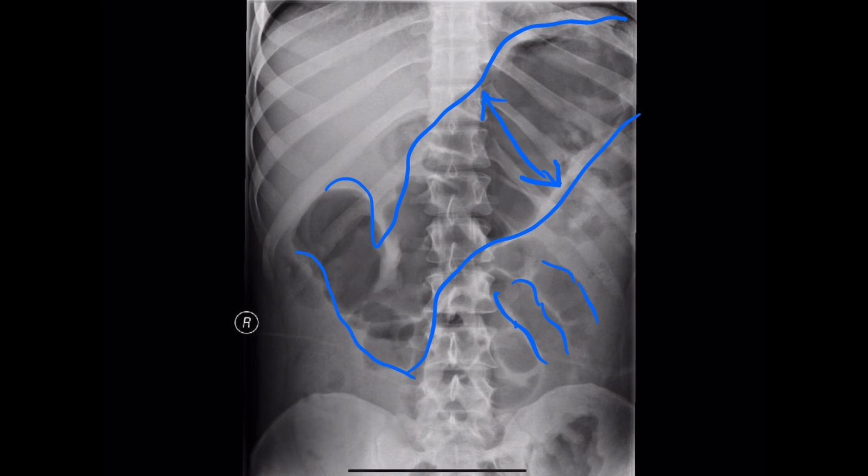Okay. So this is pathology. This is serious. To my mind, I've given you clinical context, and it could be what I would call a toxic megacolon. Correct. Yeah. But if this gentleman or gentlewoman had an obstructing lesion further down, this could be colonic dilatation. It could. So you're right. The bowel is bigger either because there's a downstream pathological obstruction that's causing the bowel behind it to swell up, or in this case, because we know the history, there's an intrinsic abnormality in the colon that is causing the bowel to relax and pathologically expand.